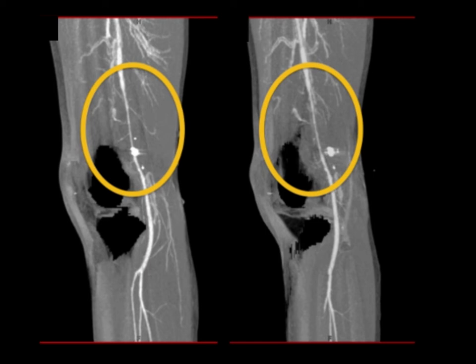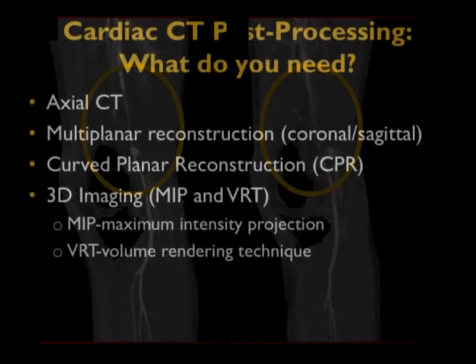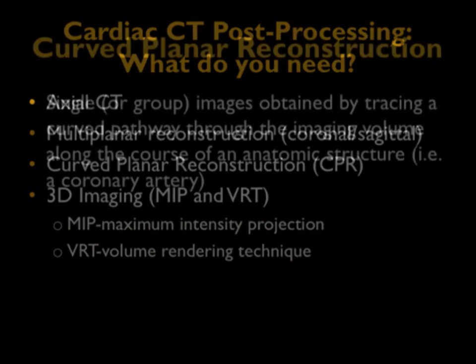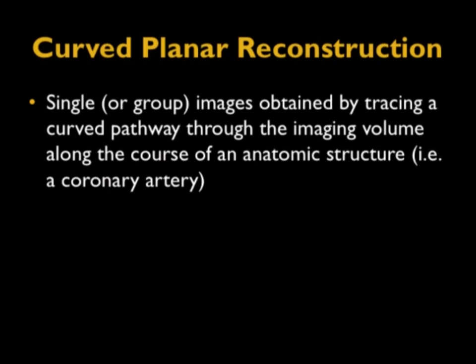It was felt that probably there might be some spasm present. They had good pulses distally. But you can see how good the CTA is and how easy it is to perform even in the traumatized patient. Now, I'll mention cardiac as well, because cardiac is one of the areas where post-processing is so critical. And many people still look at cardiacs with axial. Truthfully, you must look at the multiplanar. And when I put multiplanar up there, I always mean also curved planar reconstructions. Many people put that separately.